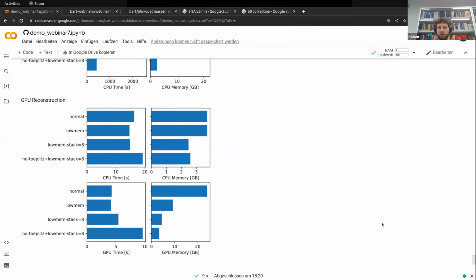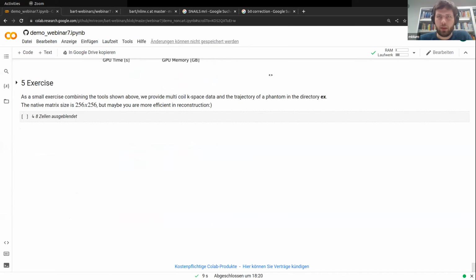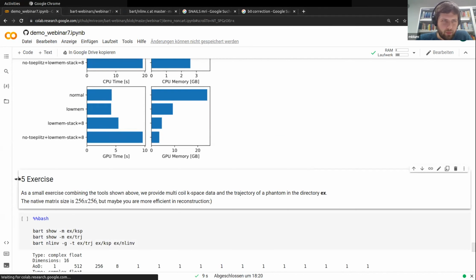That might, I hope at least, be fixed by providing a normalization of the data. That should, I hope, be possible. Just check it out, what we have. I think we can turn out.